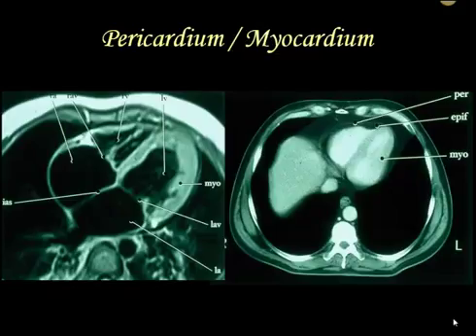That's the one that's to the left, and a CT scan. This is a slice that is further inferior to the one to the right, to the left, and again, it's axial. Couple of things about this. First of all, what you're looking at right here is the vertebral body on this MRI. There's the vertebral body right there. So this is telling you in both of these cases what you're looking at here overall is posterior.